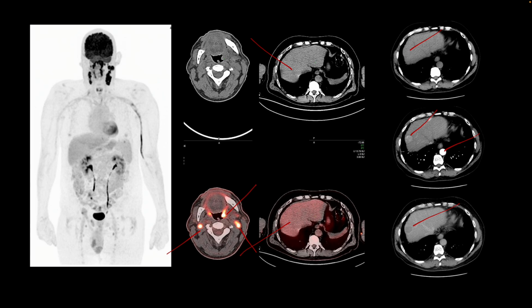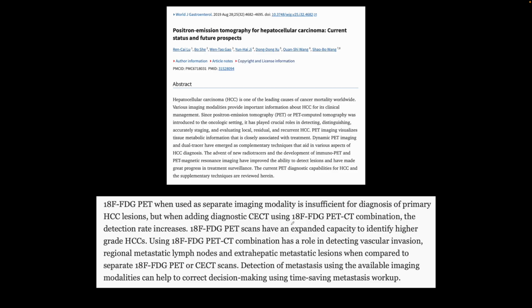These findings suggest that this is a hepatocellular cancer, or HCC, and we use the LI-RADS criteria to evaluate these lesions. Based on the size, this would be an LR5 lesion, and so no biopsy is needed in this patient. This would be HCC until proven otherwise. The interesting point of this study, the PET-CT scan, is that there is no focal hypermetabolism seen in this primary HCC in the liver, and we know that this is a limitation of FDG PET.